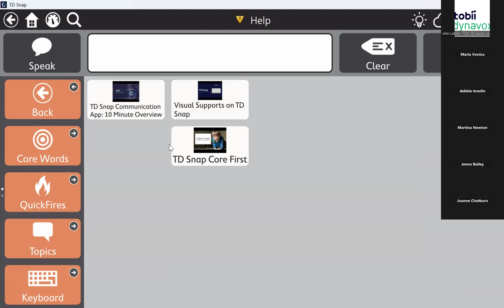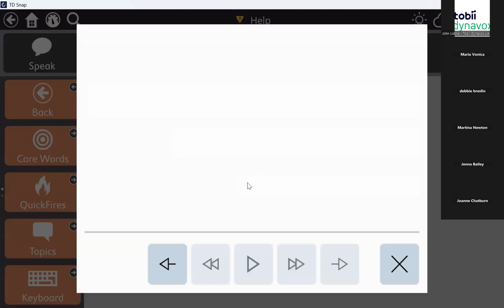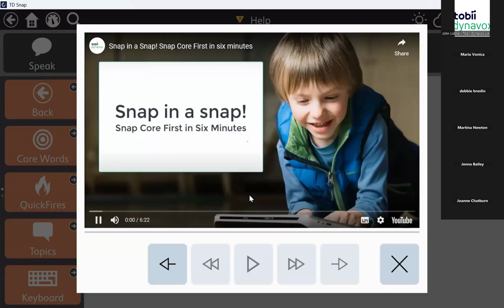This might just help in terms of, the family doesn't have to navigate on their own. Maybe they don't know where to go. There's a lot of YouTube videos. Maybe they're not sure which one to click on. If we're able to customize and add on the specific videos that they're looking for and just for support, then they've got it right here if they need help. I'll just show you a quick example.